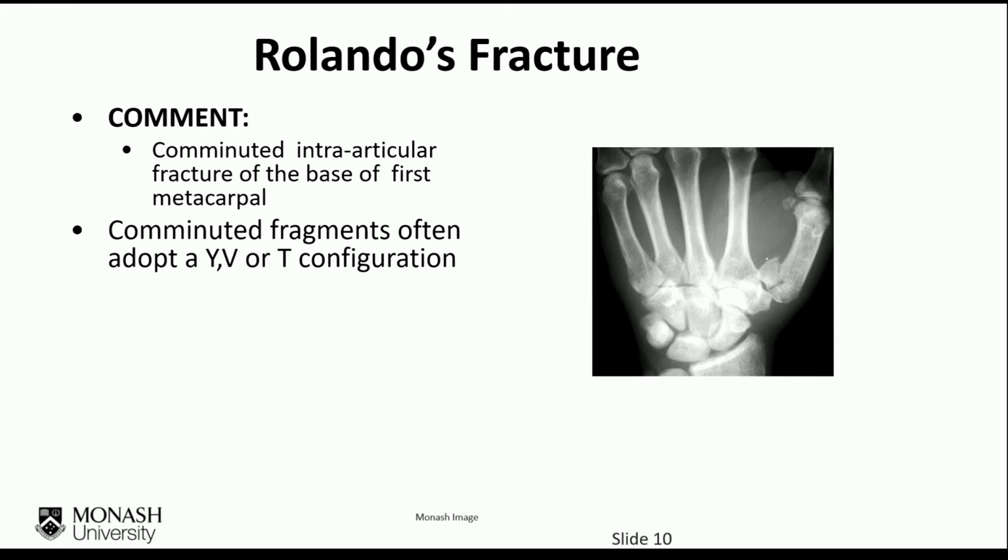Rolando's fracture is in the same position where you would find a Bennett's fracture. However, it's a comminuted fracture. It's intra-articular and has either a Y, as in this case, or a V or a T configuration.